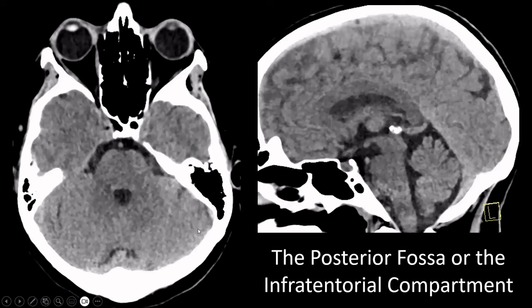We haven't really talked about the infratentorial structures, the brain structures located underneath the cerebellar tentorium. I'm just going to do it very briefly because here is the tentorium cerebelli. What we find there is the brainstem and the cerebellum. The brainstem has several components. Let's look at the sagittal image.